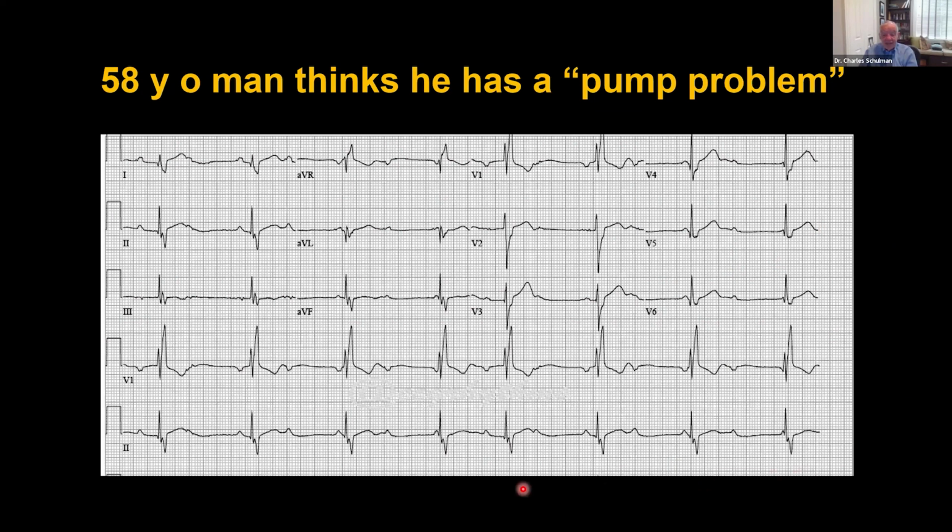I won't comment on that. But if you notice here, let's look at he's got which bundle? Right or left? The answer is right. Okay. So the ventricular rate is 300, 150, 100, 75, 60, 50, it's probably 45. So the escape rate is about 45, and you notice that the P waves seem to march right through.